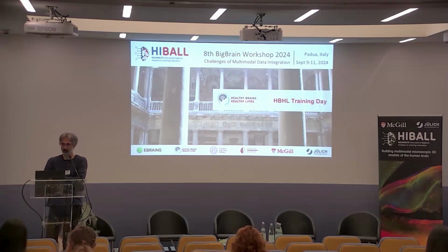You are getting there. So it's something that is in the program of your study. So I think you will develop a good tool. Well, the tools we provide are actually not really designed for pathological stroke subjects, so far. But there are possibilities to use external tools for the tissue segmentation. You can use, for instance, FreeSurfer.